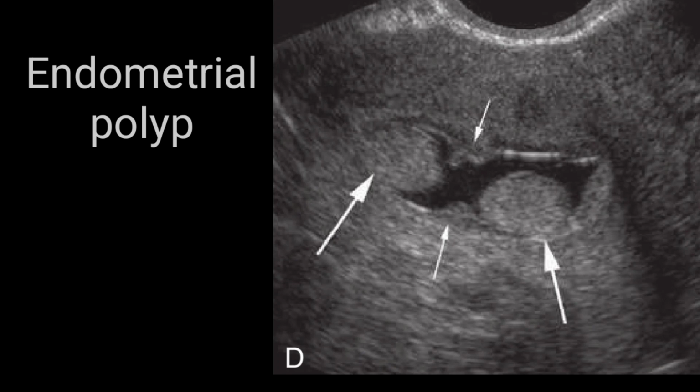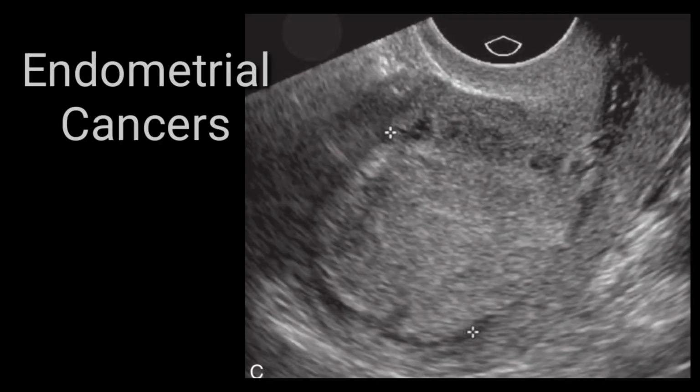So any confusion relating to the endometrial polyp and its different positions and its different diagnostic tools, we will discuss all these things at length. But this was just an example of the endometrial abnormality that you may bump into while doing a transvaginal scan. It is just for your understanding, that is endometrial cancer.